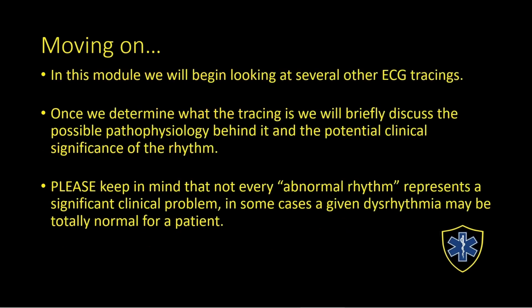So as we go on now into different rhythms, let's look at some other EKG tracings. Once we determine what a tracing is, we'll discuss some of the pathophysiology behind it and potential clinical significance of this rhythm. Now please keep in mind that not every abnormal rhythm or everything that doesn't fit perfect normal represents a significant clinical problem. In some cases, a dysrhythmia may be totally normal for that patient. There are many patients walking around today who would have an ECG rhythm that is not textbook normal, and we need to understand when this means something and when it just happens to be a little bit different.